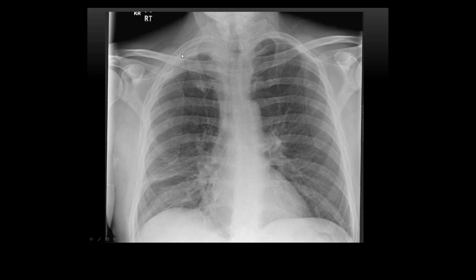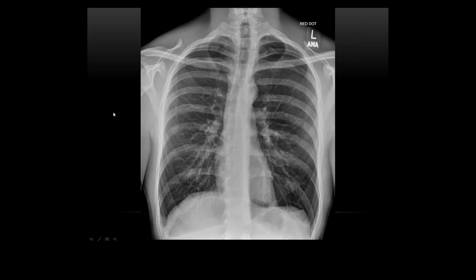So this was actually a Pancoast tumour. And the reason that this was a bit denser is because they had a bit of lymphadenopathy. And then this was just some incidental consolidation. So again, always look in your right apex and compare the two sides. Okay, moving on.